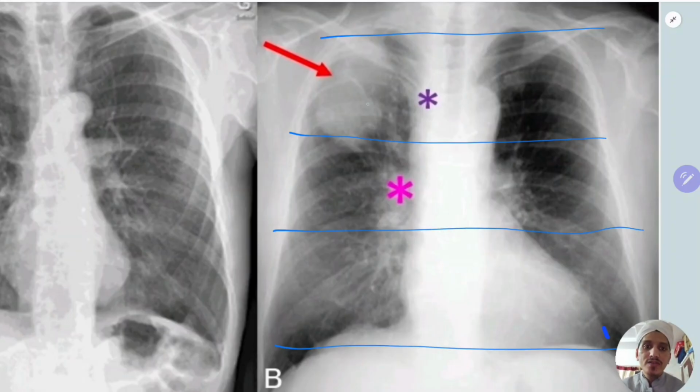Now you compare this and this. So here you can see a mass, you can't say this as a nodule, it is a mass-like thing, very big in size, and you can see spiculated margins. We are not able to make out these asterisks which are marked, but as they have marked, maybe there are again 2 nodules. And as such there is no collapse, consolidation or interstitial opacification. You can see a mass with spiculated margins, so likely it is a malignant nodule.